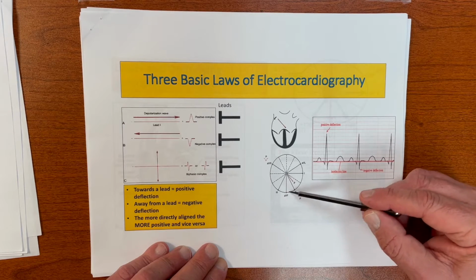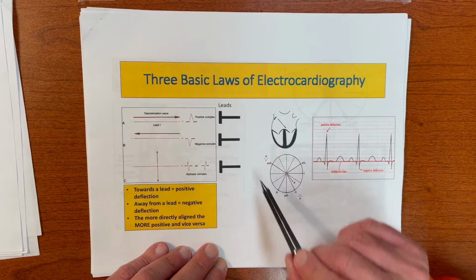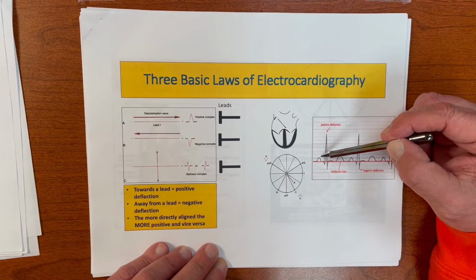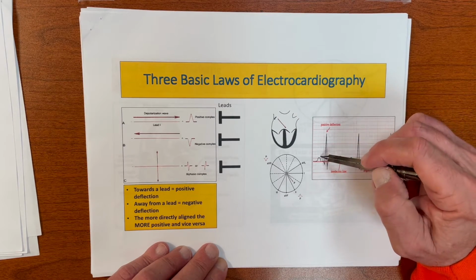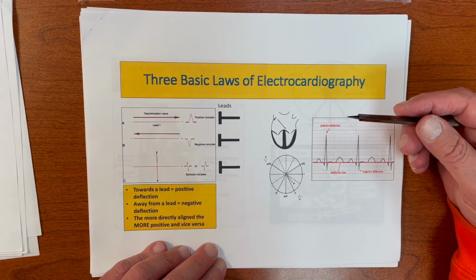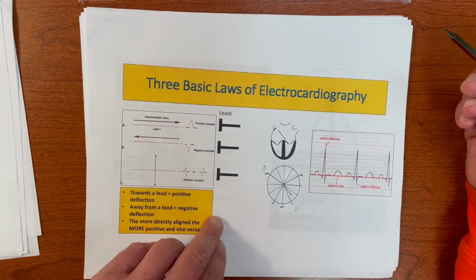leads, the inferior leads. Think of these as looking up, and that would generate a positive P wave. Okay? And there we actually just diagnosed sinus rhythm. All right?